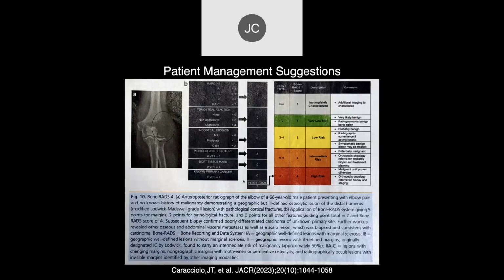So that's kind of the way it works. They recommend using this as kind of a bone rad system to score these for possibility of malignancy.